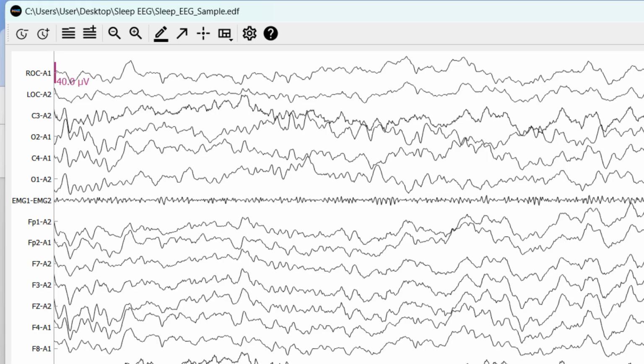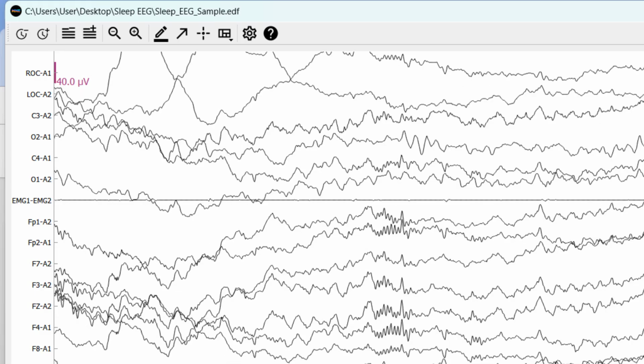Because the overview bar is extremely compressed in time and amplitude, it is not meant to be readable as EEG, and instead it acts like a heat map that highlights where unusual events occur. The reason most of the bar is blue is that most of the recording is normal, and the red spots might indicate that there is some abnormality in the data. And it lets you quickly navigate long recordings and jump straight to the problematic segment.